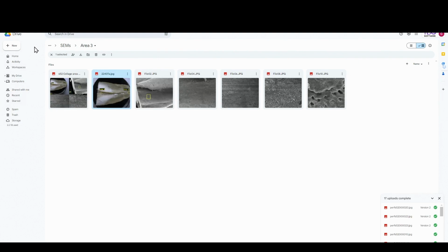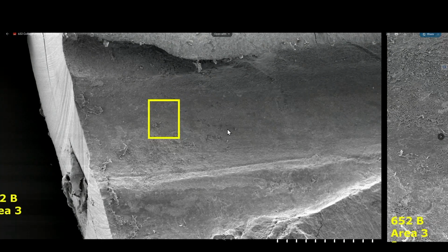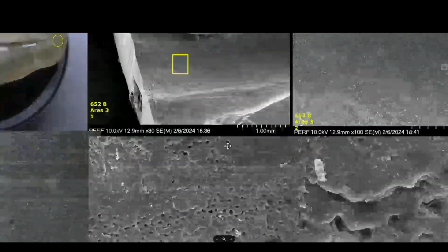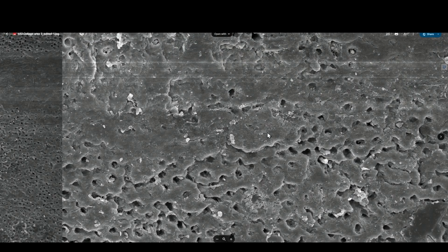Now, when you go up into the area 3, up near the orifice, the picture changes dramatically, and you can find no candida-like organisms there at all. And you see just basically the mineralization front, some minor smear layer, but most of it has been removed and demineralized. And you see many open tubules that are in a partial stage of being demineralized.